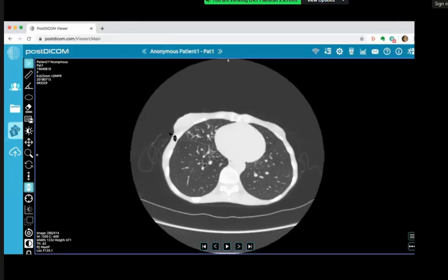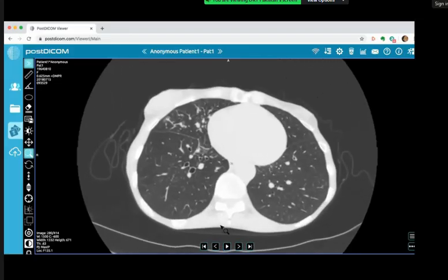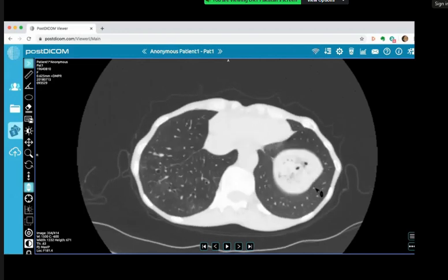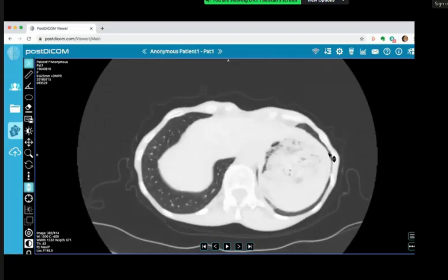Can you see any bronchi here within the middle lobe? I can see them, but I think there's some mucus plugging. Yes, exactly. And some tree-in-bud nodularity. I can also see some bronchial wall dilatation in the right lower lobe. That's correct, yes. And I thought I saw some further changes which look slightly infective in the lower lobes here as well.